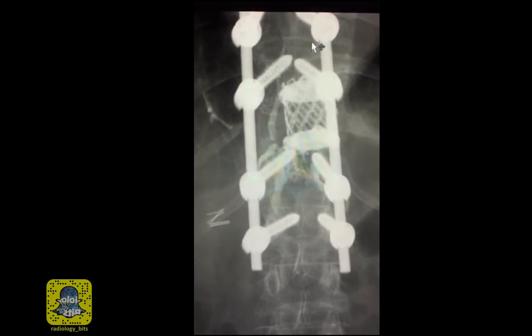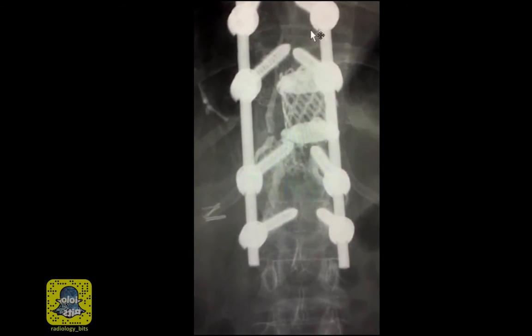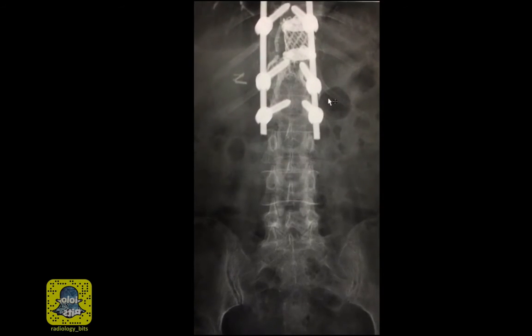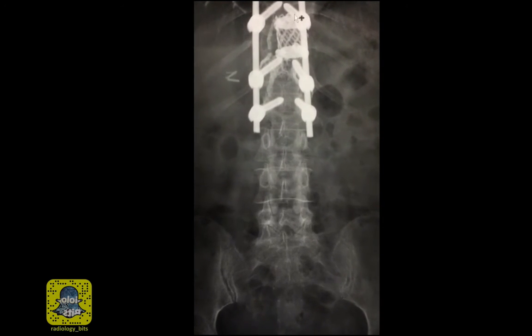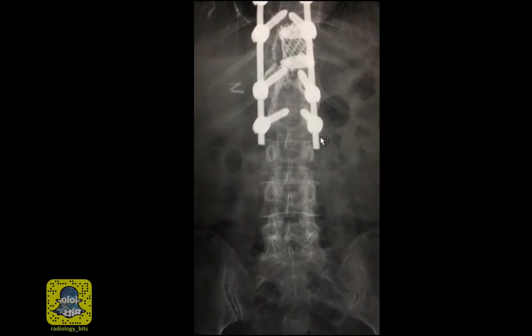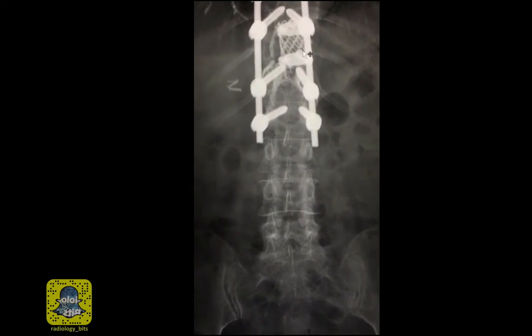Unfortunately, such material would remain stuck within the pulmonary vessels as long as the patient lives. Our quick teaching points from this case is that when you look at the abdomen, you should also look at the lungs. Don't forget that. We also learned a little bit about vertebroplasty and a complication related to that known as cement embolization.